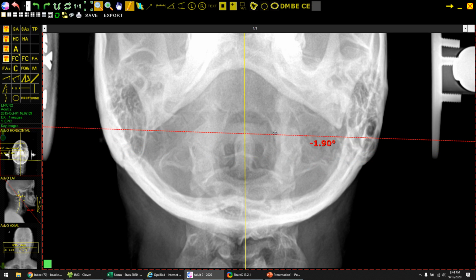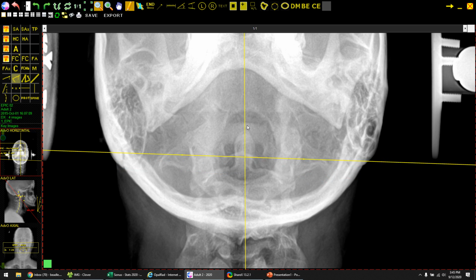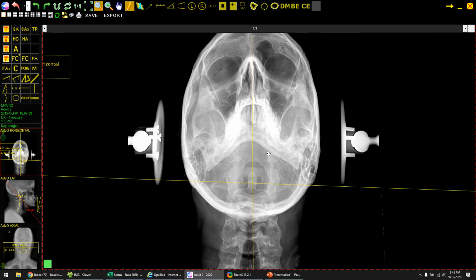But it could also be the anterior superior facet of C1 or the posterior superior facet of C1. The other one would be the neural canal of C1, which I'd be really interested to see how you guys view. This is how we're describing that, going from the anterior tubercle of C1 to the posterior tubercle of C1. And if all those match up, then we're great. We could use any one of those lines to describe where the atlas is sitting on that horizontal plane. So that's it from the horizontal.